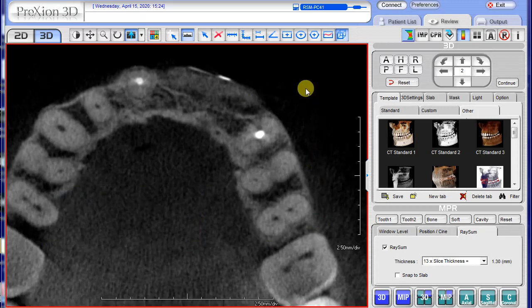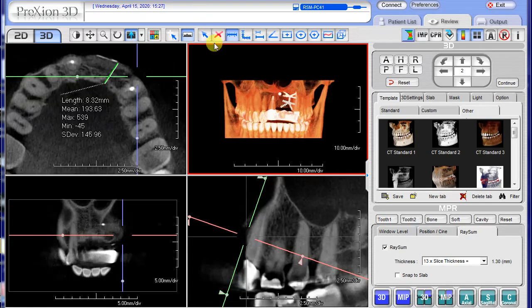This 3D cube icon is not active in the measurement toolbar, but just realize that it's there. This blue arrow allows us to perform another function while in the measurement. Click the blue arrow once or twice, and we can perform another measurement like moving the crossbar.